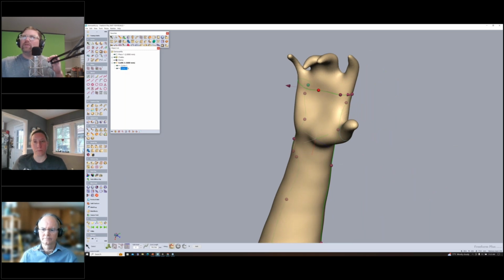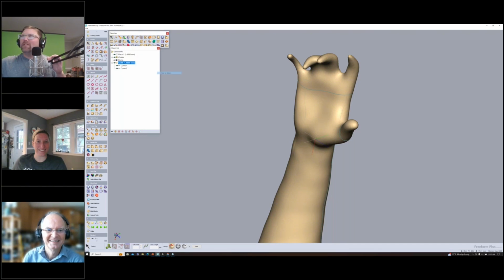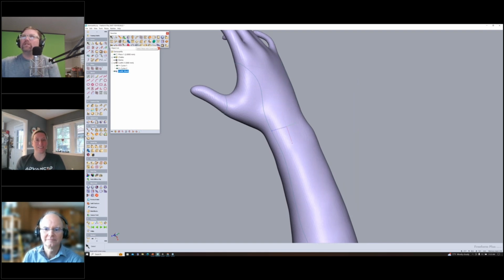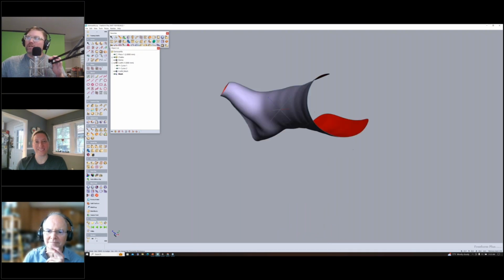And so what I do from here, and Kevin, you may not love this, but this is what I've found works for me. And I just wanted to use this opportunity to also challenge other software manufacturers to allow clinicians to get to this point right here. So I have gone back into the mesh tools, and I am going to select the brace that I want. Now I have everything in the trim lines that I want.